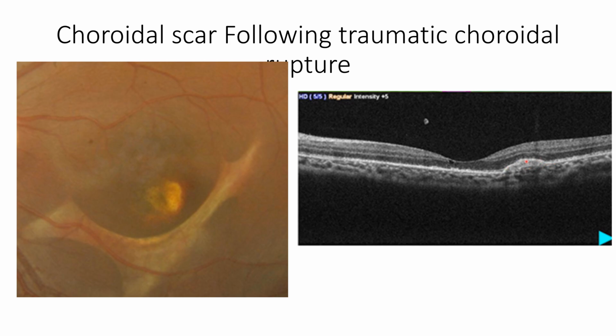So this is basically a scar in the retinal pigment epithelium which is causing some elevation here, but we can also make out the blood has resolved and there's no tissue edema except for a small cystic space here, which I don't consider is edematous. It's basically some kind of retinal degeneration.